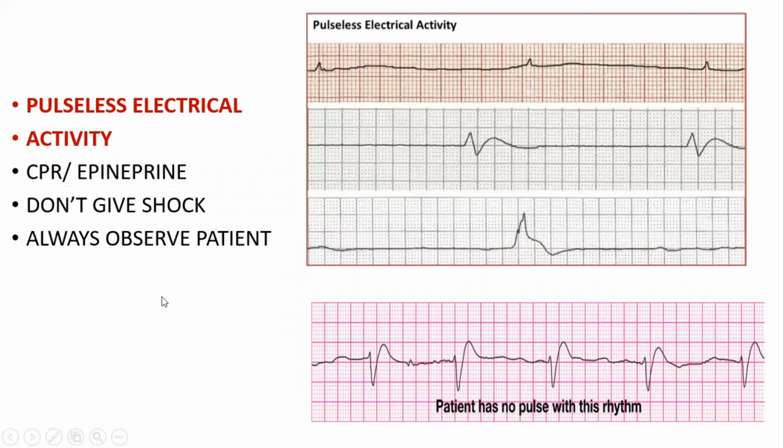This is pulseless electrical activity on ECG. There is no pulse in the patient. We should give CPR and epinephrine, but we should not give shock in these patients.